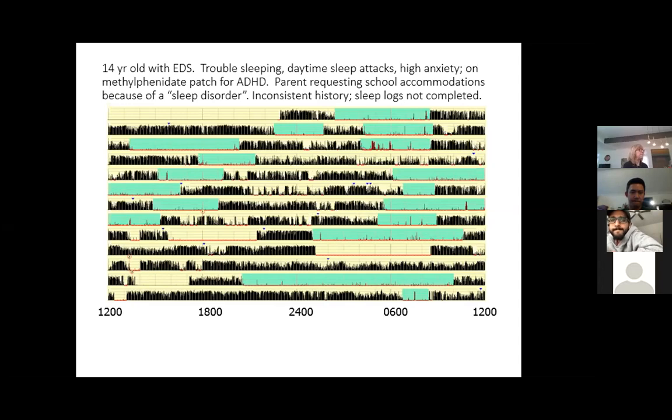Okay. So tell me what you see. How good is she at pushing her event button reliably? Not very good. No. So here, I didn't mark sleep because I think she took her watch off, but I can't be sure. But this to me looks like watch off. This looks like watch on. Do you see the difference? Right.